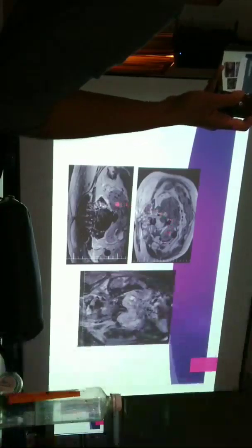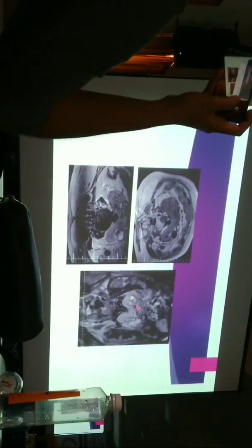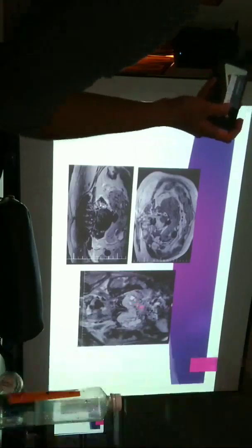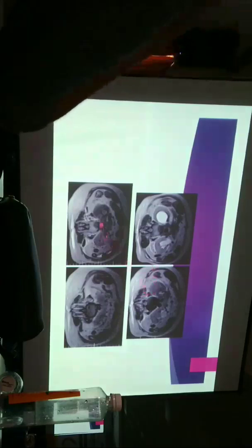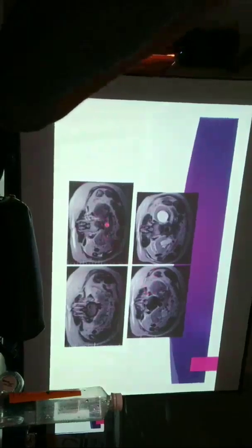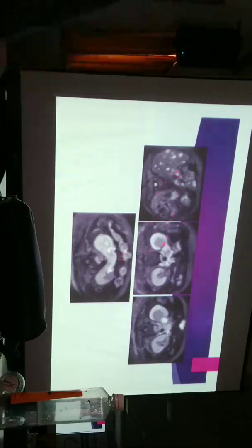This is a renal cell carcinoma within a horseshoe kidney, seen in the right renal lower pole, that has caused lymph nodal metastasis with bone marrow invasion as well. You can see the tumor within the right renal lower pole and the isthmus; the left kidney appears normal. This is the same patient, showing diffusion weighted imaging and the STIR images; multiple hepatic metastases were there as well. The horseshoe kidney is more prone to renal cell carcinoma, and this patient presented with back pain due to involvement of the vertebral bone marrow.